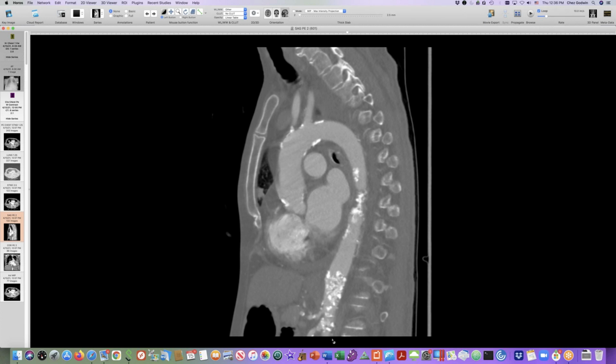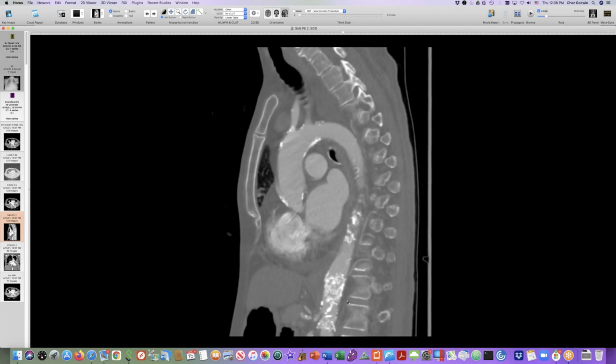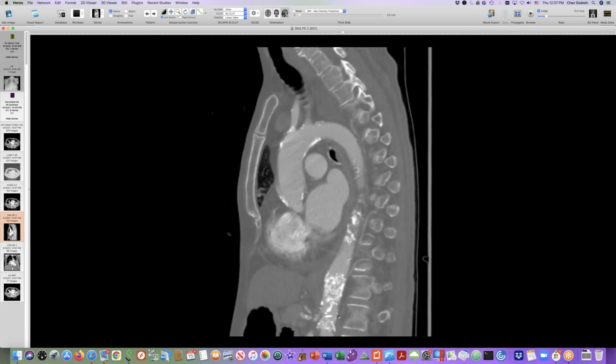But one of the suggestions yesterday was, could this be a crumpled up and displaced stent? So that some of the laciness could be the metallic components, and maybe there's secondary calcification on top of those. If this were actually a matrix of little wires, that could account for its being non-occlusive despite occupying the lumen.